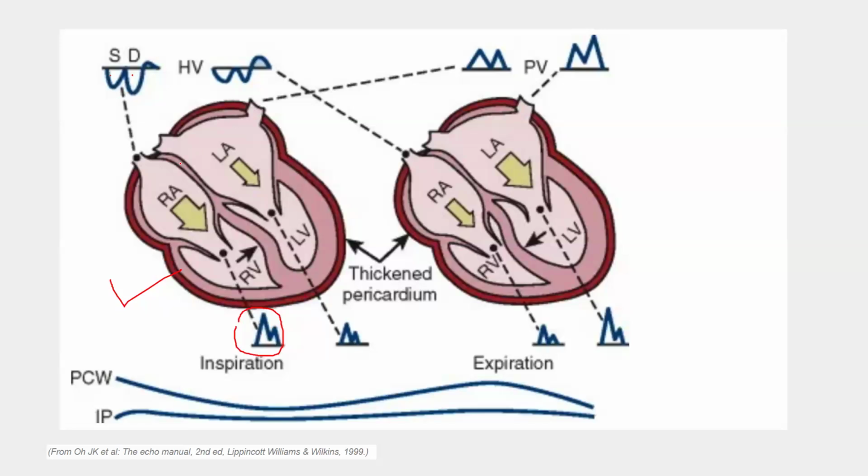Now, if we take during expiration, the septum is going to flip rightward. So what is going to happen here? It's going to compromise the right side and increase the pressure on the right side. How does this translate in hemodynamics? When you see the hepatic Doppler, see the forward flow? The forward flow is going to decrease a little bit. But most importantly, you are having a reversal here, which is bigger than in here. And I'm going to explain this later.